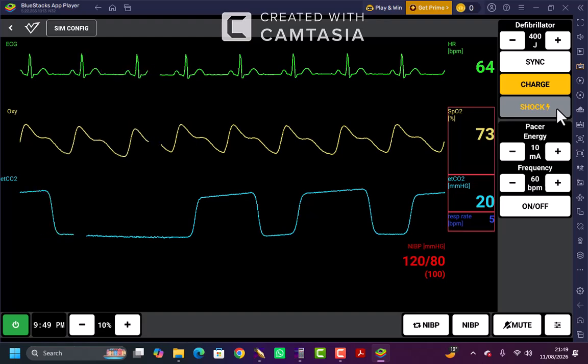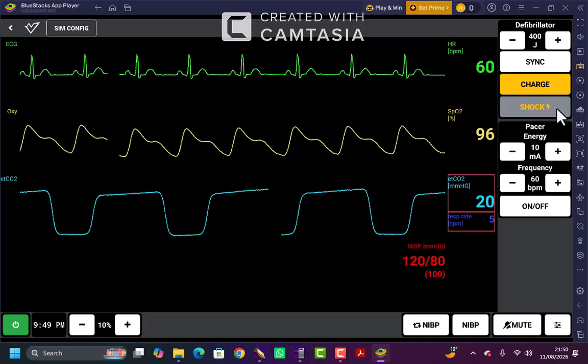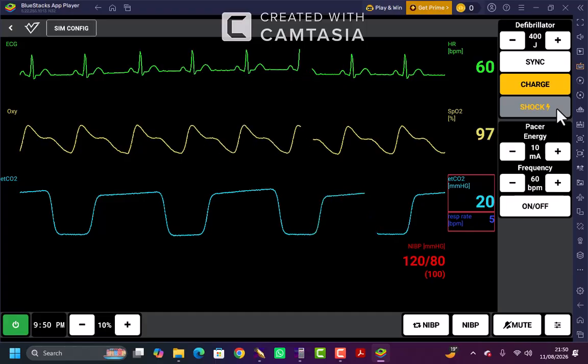You long press shock, while others short press shock. But health guidelines always recommend to long press the shock button for less than 1 second. Then it will shock the wave to the patient, then it will revert to NSR.